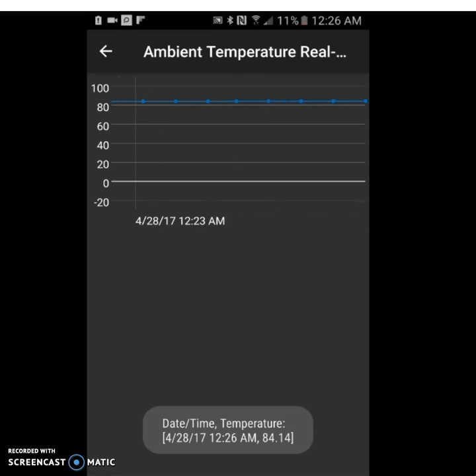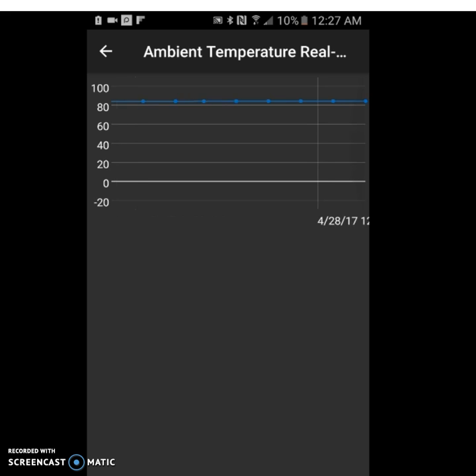The same way, you can zoom and scroll through the graph. It'll populate the graph with the last 20 values that are in the database, and then every 30 seconds start plotting the next value from the sensor onto the graph. So we'll wait the 30 seconds. And you see here that it plotted a new value.